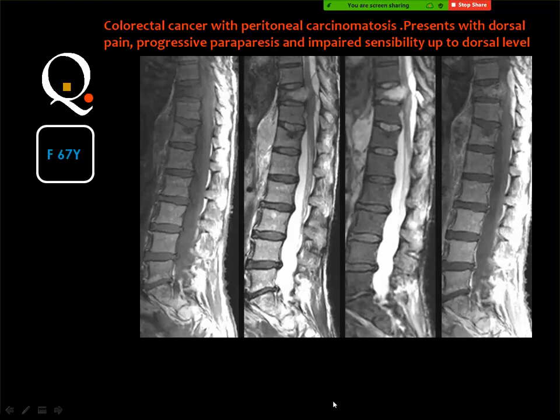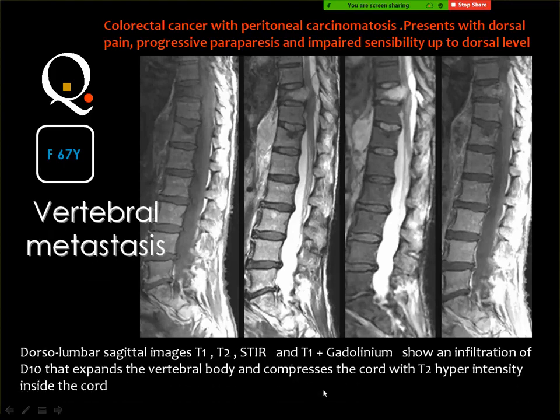This will support the diagnosis of metastatic deposits, because you know that a patient with primary malignancy may have an osteoporotic fracture of the vertebra, and the fracture will show abnormal signal. It will show contrast enhancement, and this is very important. Bone marrow edema of whatever etiology will enhance with contrast material.